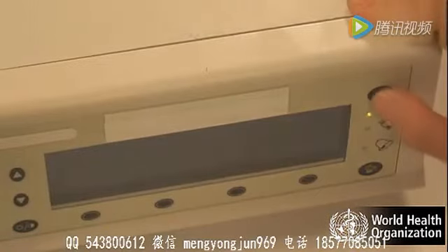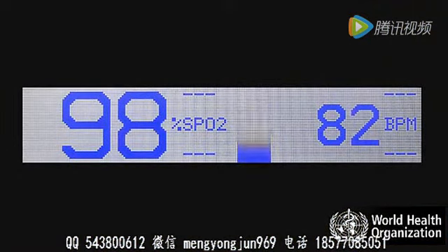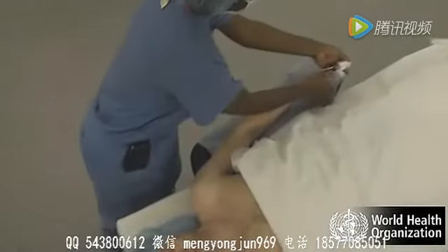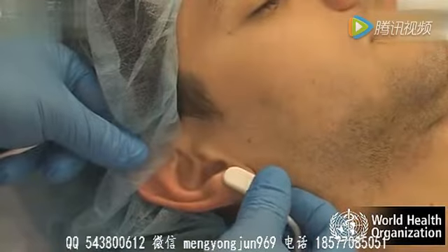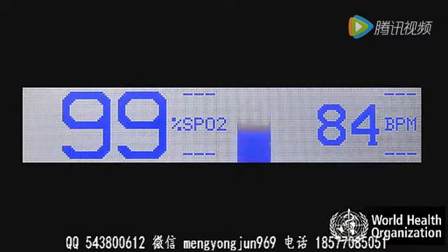The pulse oximeter measures 2 numerical values: the oxygen saturation of hemoglobin in arterial blood and the pulse rate. The value of the oxygen saturation is given together with an audible signal that varies in pitch depending on the oxygen saturation. A falling pitch indicates falling oxygen saturation. Since the oximeter detects the saturation peripherally on a finger, toe, or ear, the result is recorded as the peripheral oxygen saturation, described as SpO2. The pulse rate is measured in beats per minute, averaged over 5 to 20 seconds.